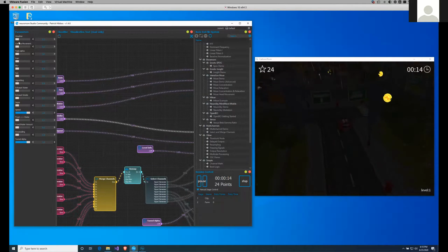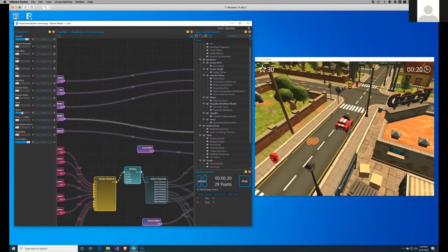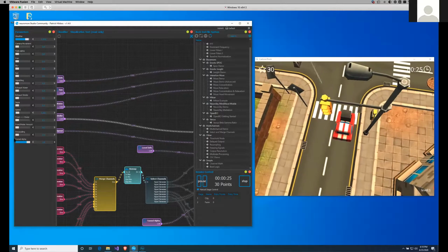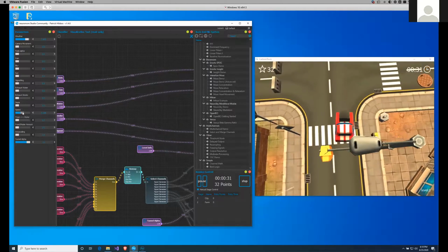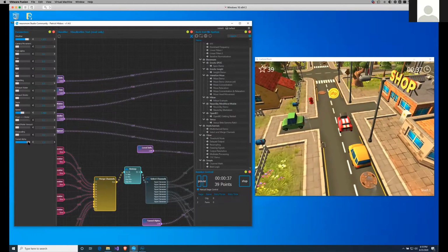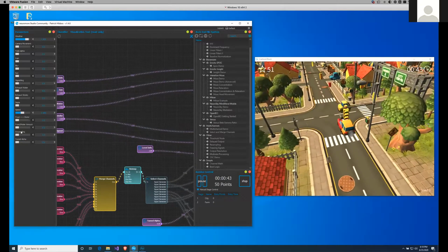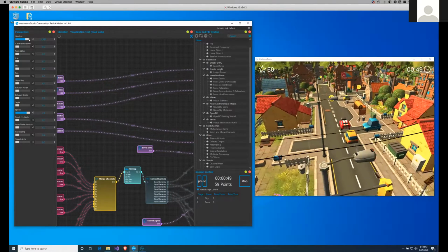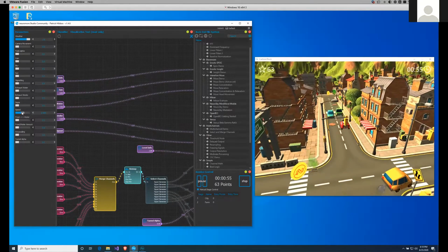So using the parameters that we have here in the studio, now we can change particular modalities of that visualization. And not all visualizations support all the different parameters. The parameters that we have in that visualization test classifier represent all the parameters for all the visualizations. So for instance, there's a parameter tunnel alpha. It doesn't work for the Cartoon Town because there is no tunnel. So the primary parameters for the particular Cartoon Town are weather and the speed.